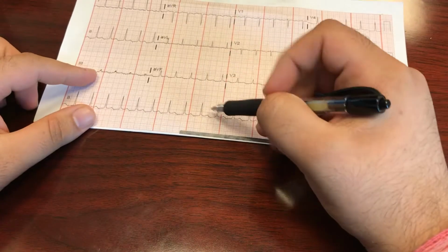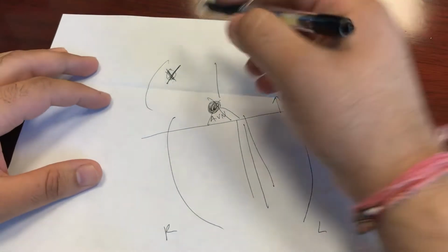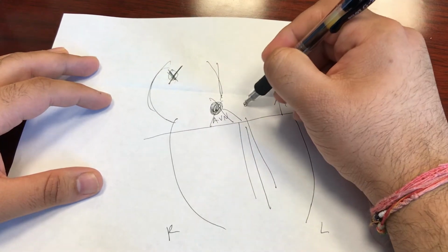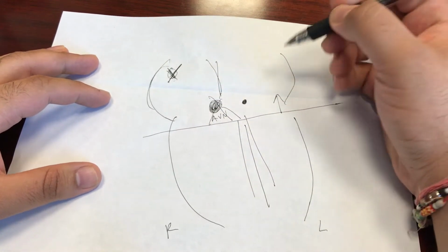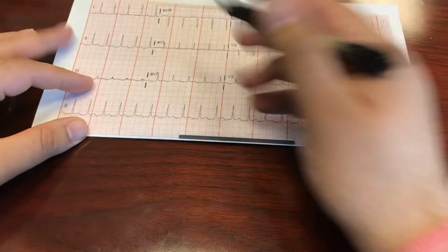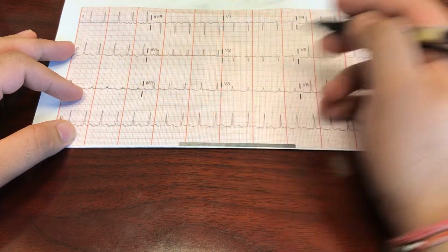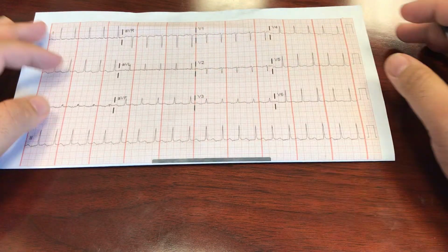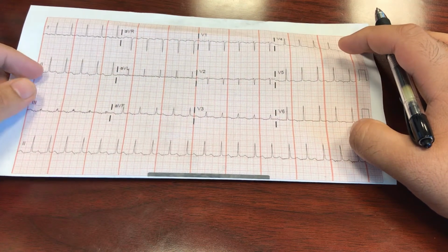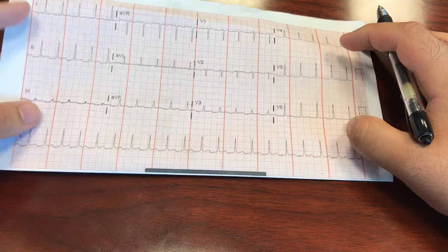So the question is, where is it coming from? The fact that it is a solitary P wave morphology that continues throughout the entire EKG means that it is coming from some other atrial focus. It could be coming from the left or right atria. A single spot has determined that it is now the pacemaker of the heart, and it takes a little longer than normal to reach the AV node, hence the elongation between that upside-down P wave and the QRS complex. So that's what makes it an atrial tachycardia. It is not multifocal, since it is only one type of P wave. It is a unifocal, or focal, or ectopic atrial tachycardia, and that is the actual EKG answer.